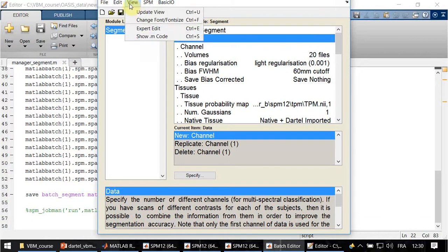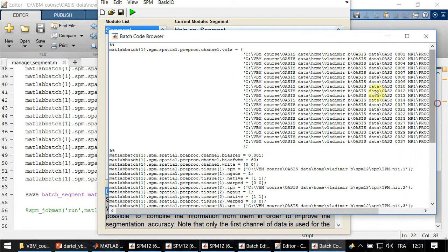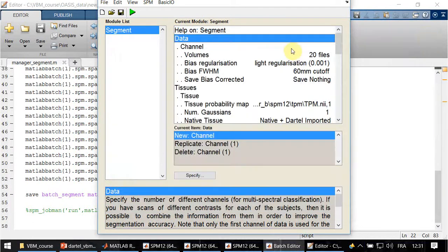First, I must not forget to show you how to extract the code. This is how to do it, quite easy. So this is all the code. You just copy paste it. It's not a lot. And then you can modify it and you can save it, which adds a lot of easiness. Yes.